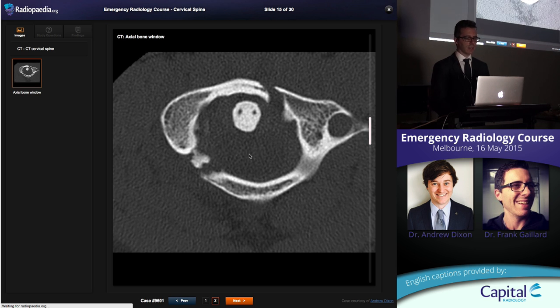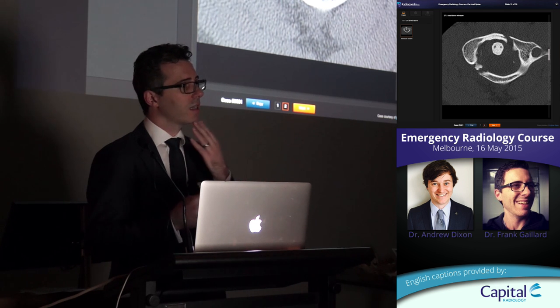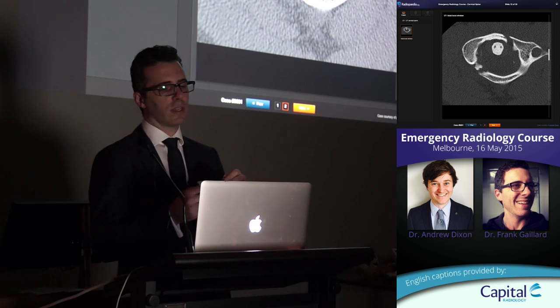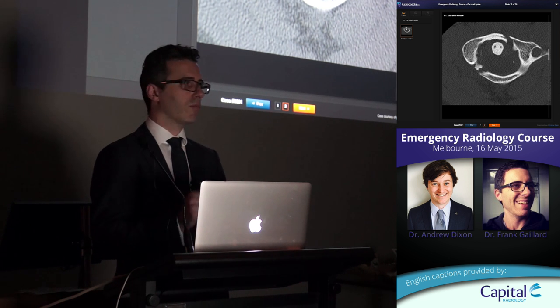You would, of course, get a CT, and here we have a typical Jefferson's fracture, just as is the case in the ankle with the fibula and tibia, or the forearm. You have a complete bony ring. That's also the case with the jaw. So you really struggle to injure these locations in just one place. Usually, it's like breaking a pretzel. You'll try and it'll break it in 2 parts, or tear a ligament and break a bone.